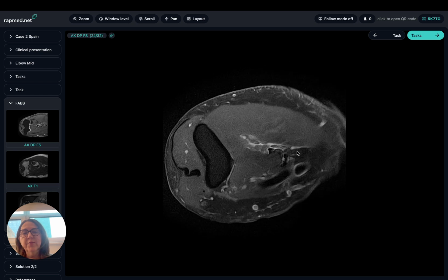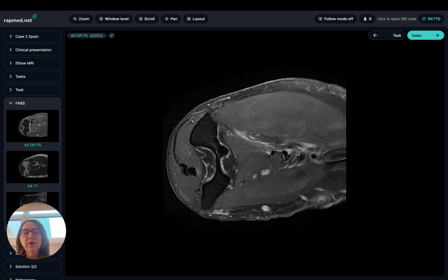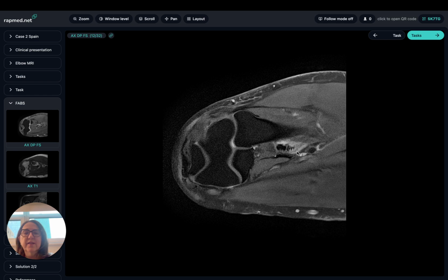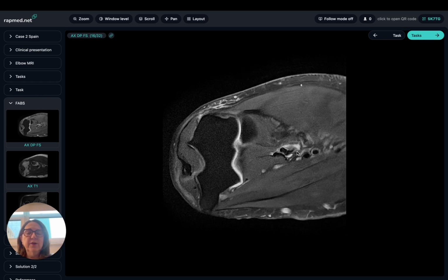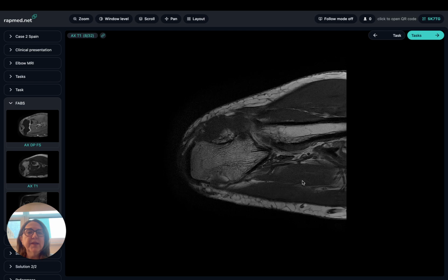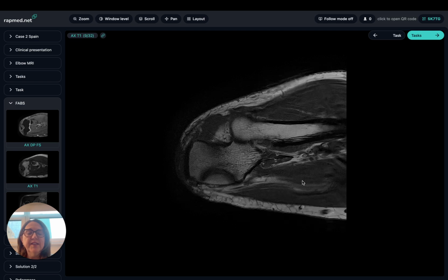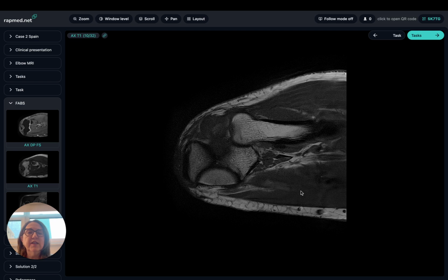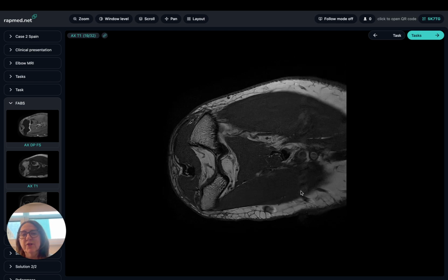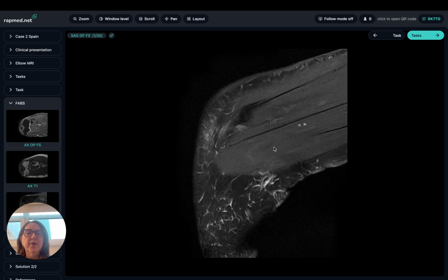You can also see, when we go more proximally, how the two heads of the biceps tendon curl and twist when they go into the forearm. Here on the T1 weighted images, you also see it very nicely. You see the long head is inserted normally on the proximal side, and the short head is completely ruptured without retraction, and this is thanks to the lacertus fibrosus.